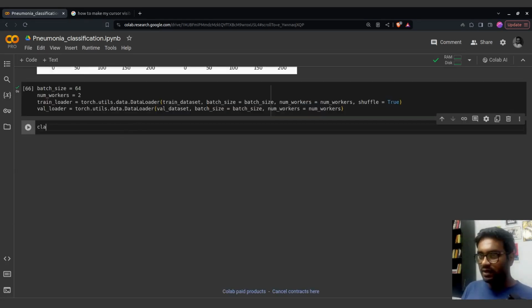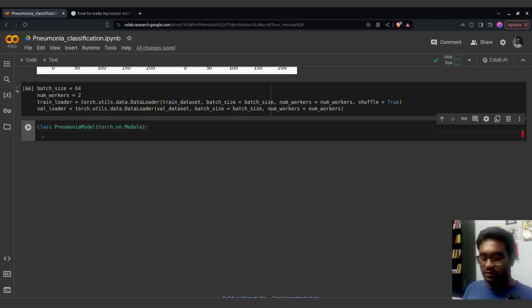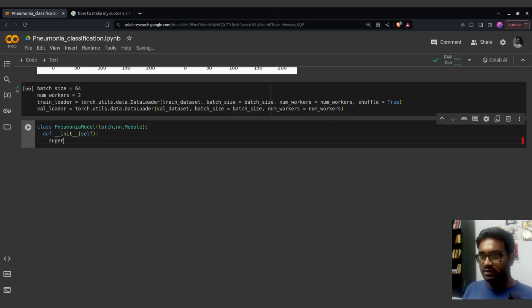So let's define our class, which is PneumoniaModel. This PneumoniaModel will inherit from nn.Module. Okay, nn.Module. Let's define our constructor. We'll pass this PneumoniaModel over here, and self.